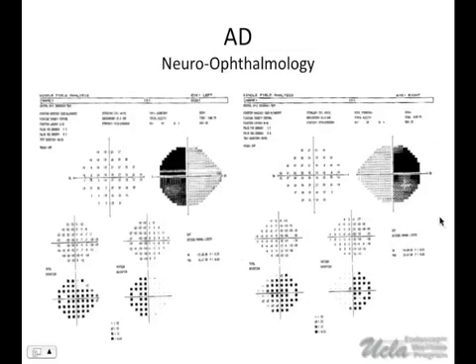So, to us, this would be localizing to the chiasm. There's not really much else that would do that. The ones that don't marginate so well on the vertical midline might be something else. Some of the ones that extend across, particularly in the supratemporal region, could be because the tumor is growing bigger and getting the non-crossing fibers. But more likely, when these things don't line up like that, it's some other kind of optic neuropathy. But in this particular case, pretty much that's a standard chiasmal visual field defect pattern.